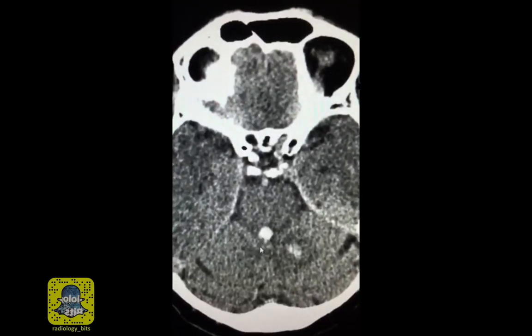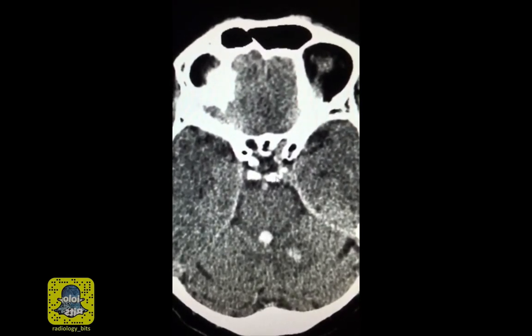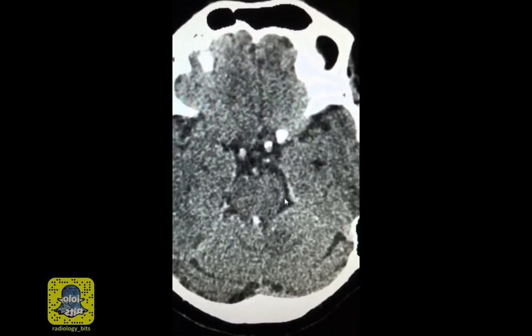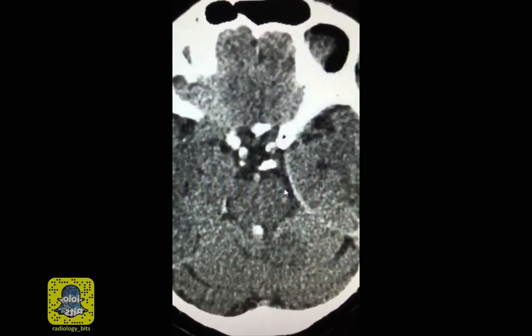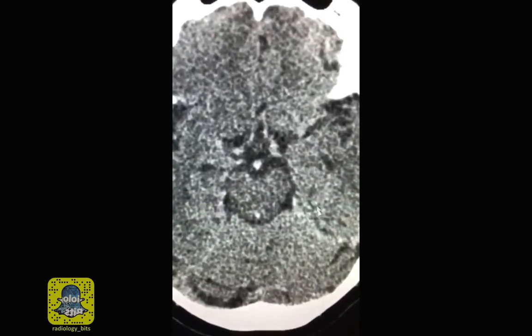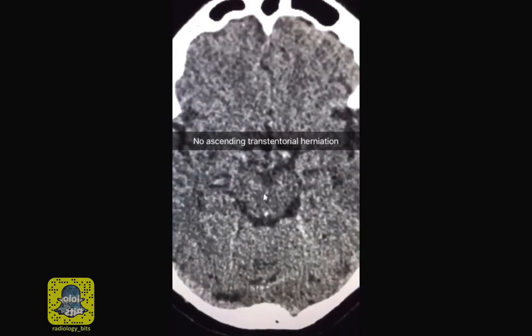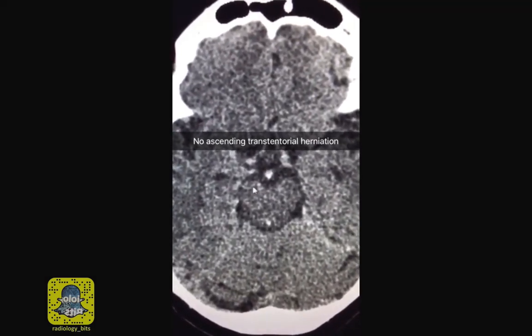Superior displacement of the cerebellum and the brainstem could be detected by seeing fullness around the CSF spaces here. CSF space surrounding the midbrain is called perimesencephalic cistern. With such bleed, fullness of the perimesencephalic cistern would denote that everything is displaced or herniated upwards. Since the tissue would be crossing the tentorium cerebelli, this would be called ascending transtentorial herniation. Lucky for the patient, none of this is seen, so this patient does not have the worrisome ascending transtentorial herniation signs.